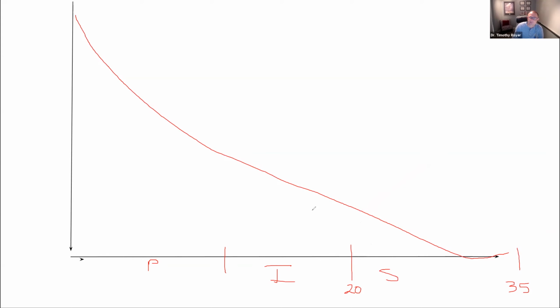That's typically what we'll see in anxiety, is they're all just high. But it's very interesting in substance abuse and particularly in OCD, what you'll see is a really sharp spike at 27 to 28 hertz, okay?